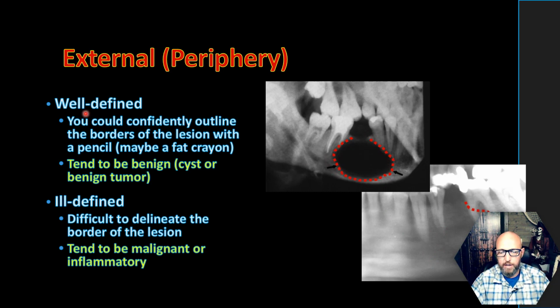I might come in the first time and say, and my head's covering part of it, these are the borders of the lesion. Someone else might say, no, I thought it extended all the way out to here. And so you're not really sure where those borders end. You can't cover it with a fat crayon. That's more your ill-defined.